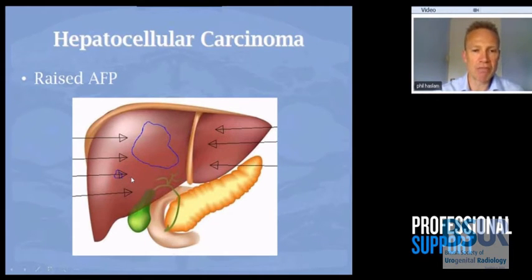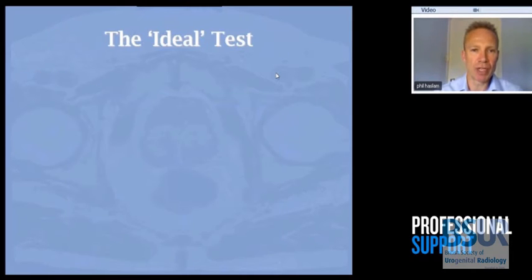So we say to the patient, yeah, there's a tiny area of tumour, very easy to treat, you're going to be fine. But what we've actually missed is this large area more centrally of very significant tumour. And this is exactly what happens in the prostate gland when you don't do MRI prior to your biopsies. You don't know where the significant tumour is.